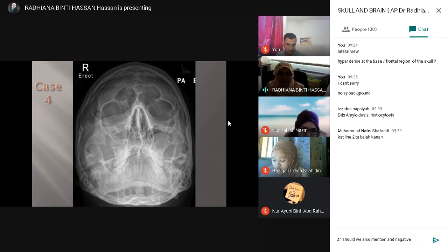On the left side, you don't see the fluid levels, but there is soft tissue opacity because this patient also had a polyp. Okay, so maxillary polyp. You can see the rounded opacity occupying the left maxillary sinus. Of course, you can see a bit of deviation of the nasal septum, but no obvious fracture or discontinuity. So this one can be a variant. Indeed, many people have this variant. The nasal septum is a bit deviated to one side. Okay, so otherwise the mandible is all fine.